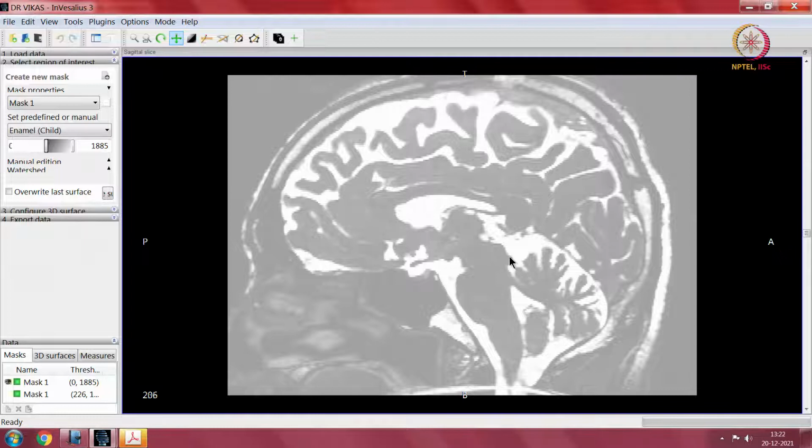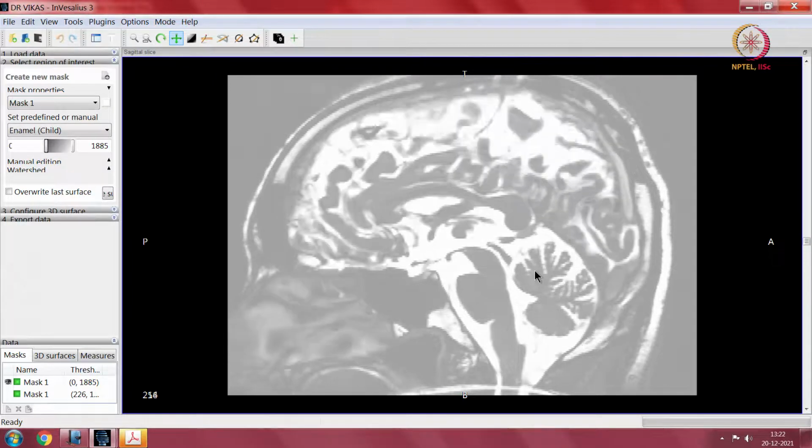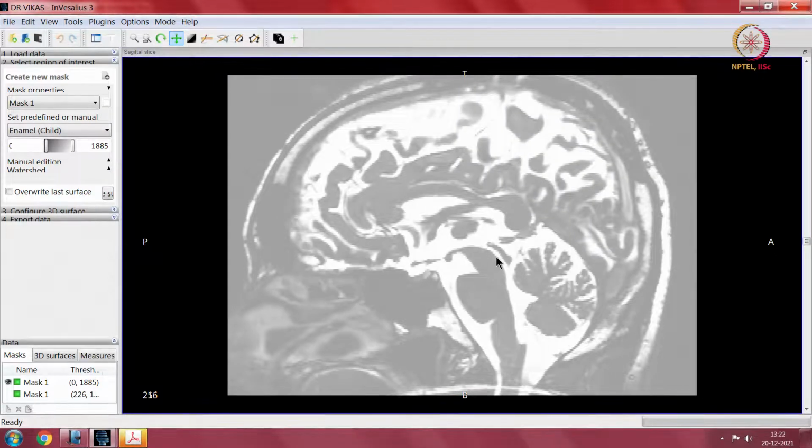Yeah. So, this is the superior colliculus, this is the inferior colliculus, and there is maybe a single section where I can show you the aqueduct. That is the third ventricle, the interthalamic adhesion. This is a section of the midline. We see the corpus callosum over here, the splenium of the corpus callosum, the genu of the corpus callosum. Eye is this side, nose is here, splenium is here, genu is here, and this is the fornix, the thalamic junction. This is the third ventricle, the fourth ventricle, and the continuation between the two, which is the aqueduct.